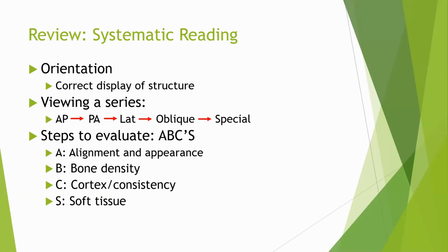Take a look at the cortical layer, especially when two bones meet or at the joint. If there is too much grinding, there will be cortical thinning present. So always take a look at that.